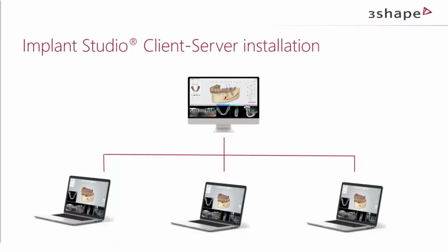How can we install it? First of all, we need to make sure that both server and client PCs are in a local network and are accessible to each other. First, install Implant Studio as a server. Then we install Implant Studio on client PCs. And then from a client PC, we will be able to log in to the server PC.